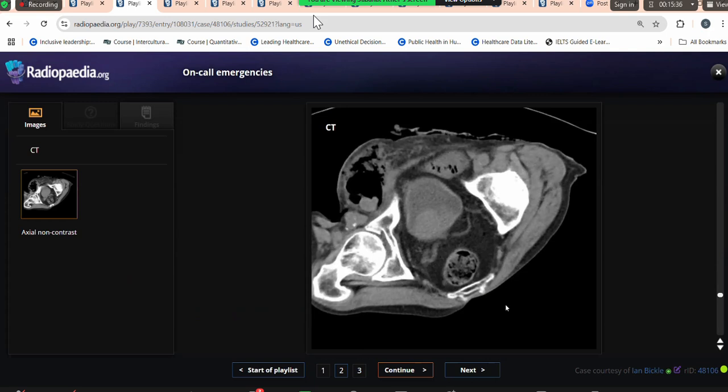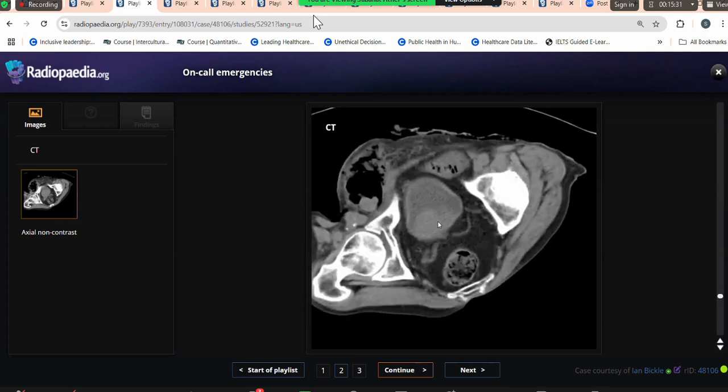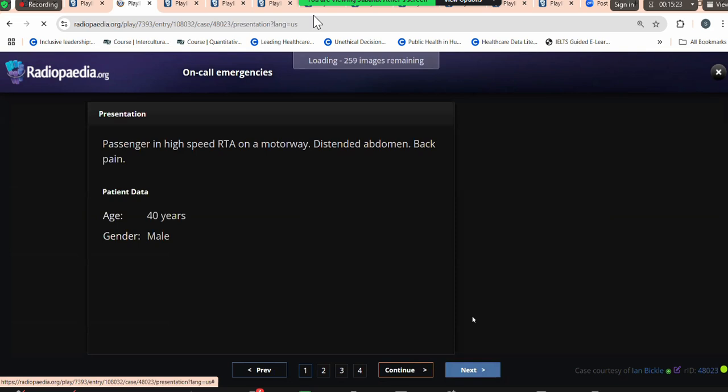That was on axial images, CT abdomen, plain. Similarly, this is actually the prostate, which was indenting the urinary bladder base. Again, one said to ignore it. So this was a case of incarcerated femoral hernia. Okay. Coming to the next case.